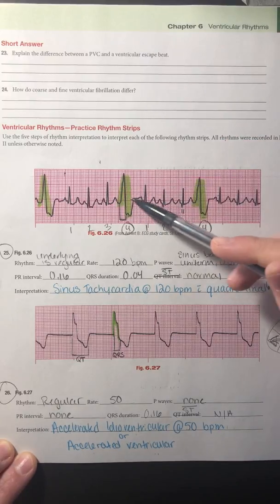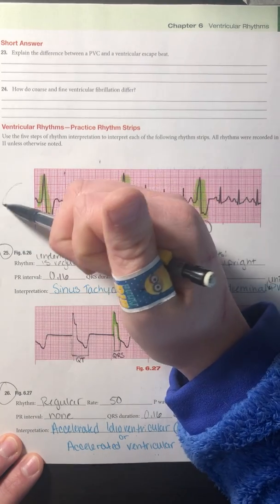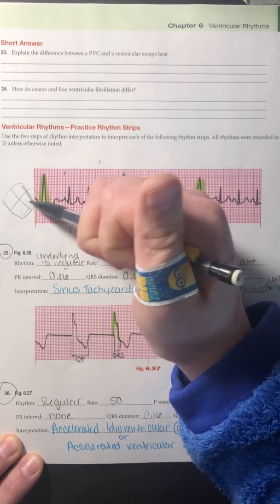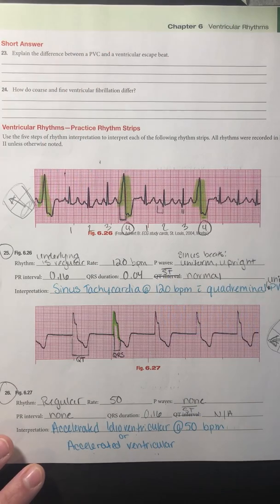The reason we have this huge ST segment depression is because, remember, we are generating a pulse from the ventricles. So in my heart, I'm generating a pulse from somewhere down here, which means I have this backwards reflection of energy going up through the atria. So that's why we get those weird ST segment depression or elevation. It just depends on where in the ventricles our beat is coming from and how that reflection of backwards energy is produced onto the ECG.